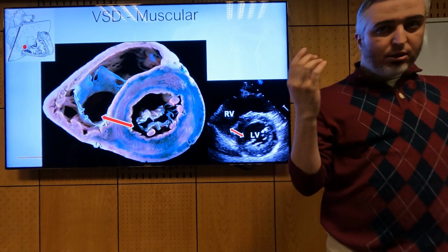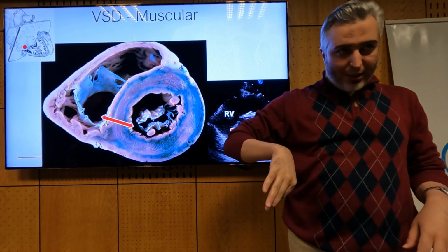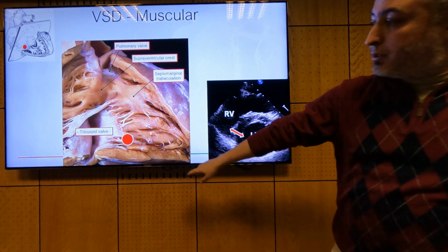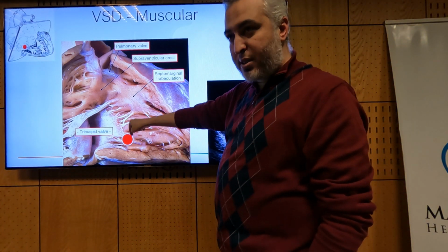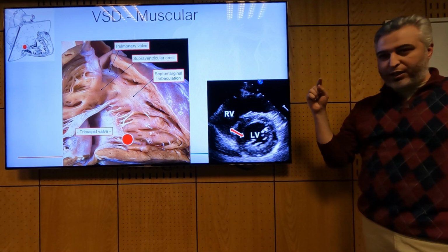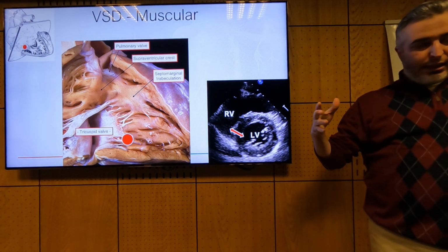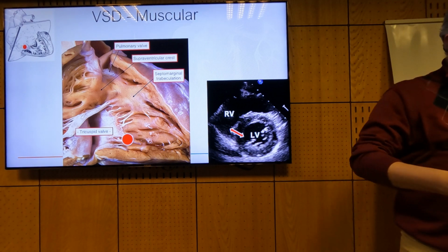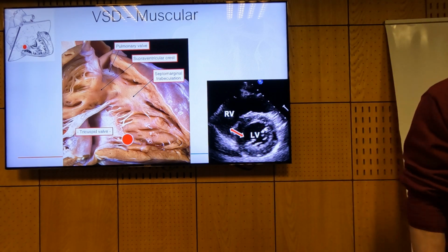So if I look through the tricuspid valve, I should be looking towards the diaphragmatic surface of the right ventricle. It would be here. So that would be an inlet muscular VSD towards inferior. Okay? It makes a whole difference if you can correlate the echo view to what you see inside the operation, and on the other hand, if echocardiographers, cardiologists, and anesthetists can actually correlate with anatomy.